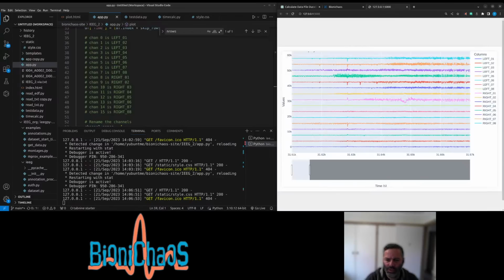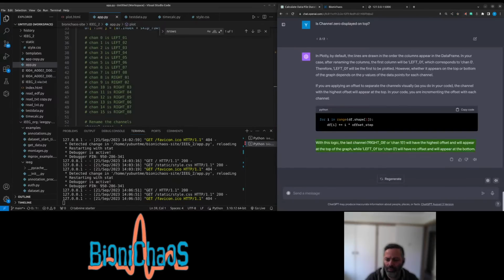What's this offset business? Okay, now I get it. Can we offset towards the negative axis, so the first channel appears on top?